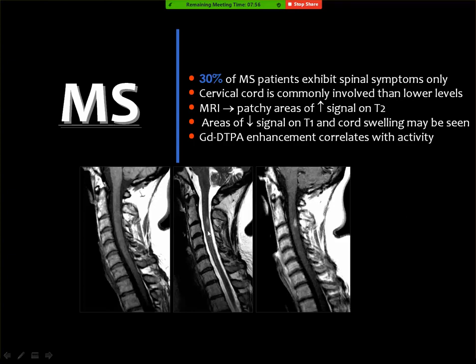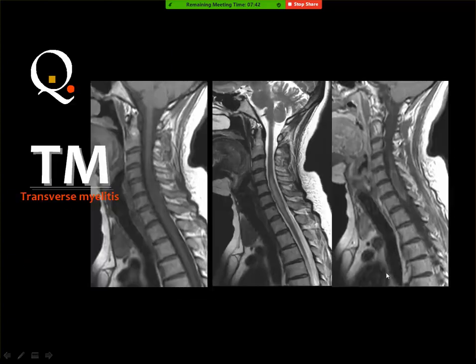Okay. And intramedullary lesion for differential diagnosis, not this, the previous one, the question. Yes, MS is an intramedullary lesion, actually. No, doctor, about transverse myelitis. Yes, the diagnosis of transverse myelitis. Yes, you should say, for comment, this is an intramedullary abnormal signal extending from so and so, and it shows low signal in the T1 and the bright signal in the T2 weighted image. And for differential diagnosis. Yes.